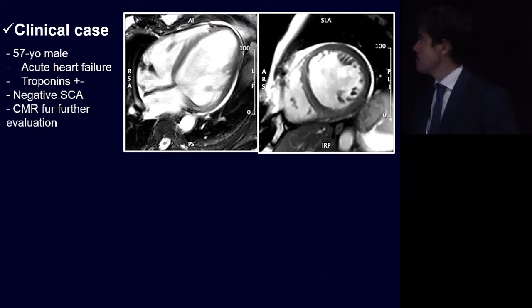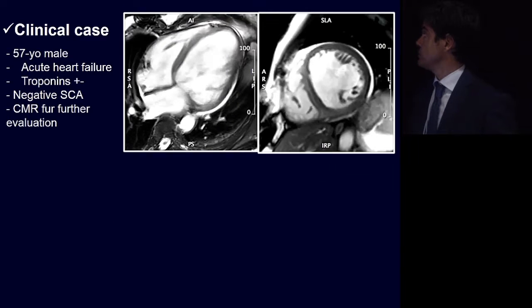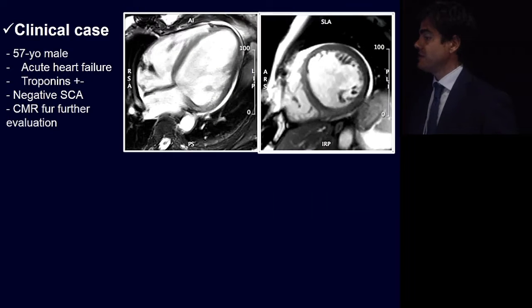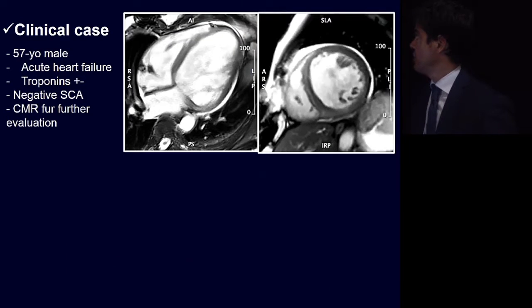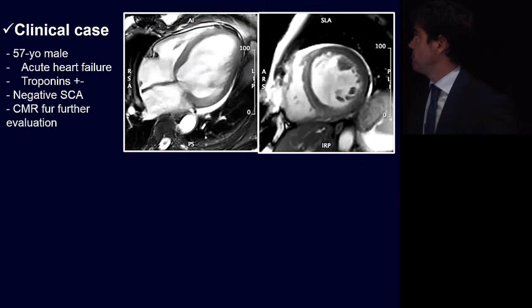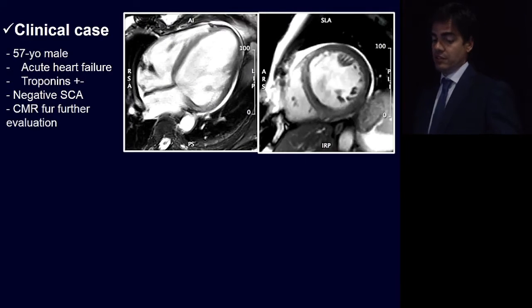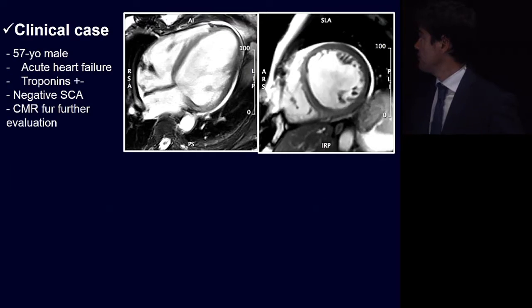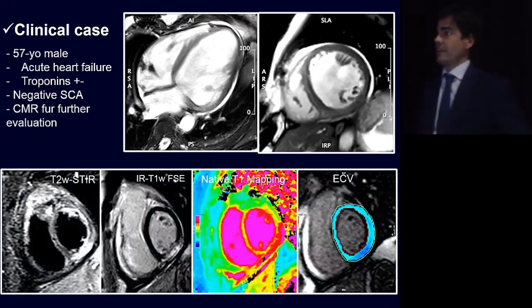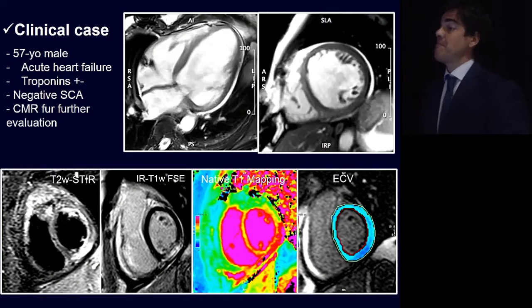Because what happens here is that there is a clear heart failure. You see, this morning we were discussing how to measure kinesis and intrinsic ventricular motion. And for some reason here, the subendocardium is not moving. There is a torsion of the apex, but overall ejection fraction is low, in the range of 20%. There is some pleural effusion here probably, not clearly depicted, and the heart is doing badly. What is this? It's a myocarditis. So this starts to tell you how much this disease can be polymorphic.